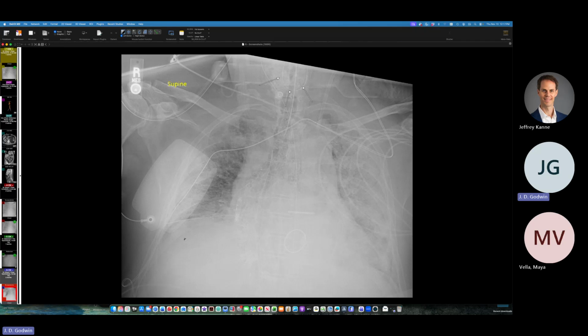And then we also have a problem here with the enteric tube being looped in the hypopharynx and not going down very far. And this can lead to aspiration. So by the way, if you see a tight loop like this that's centered in the neck, it's not external. That's the first reaction of most residents to seeing this loop here, they say, well, that's external. But if it's a tight loop like this with a narrow caliber, that's precisely the dimensions of the hypopharynx. So this is always internal and it's always looped there, and that can promote aspiration.